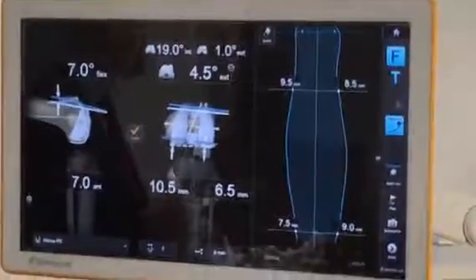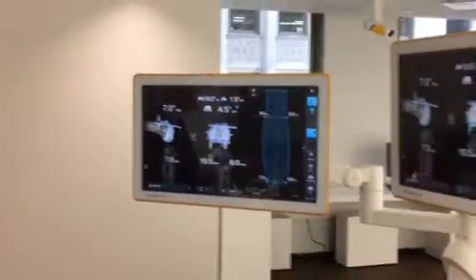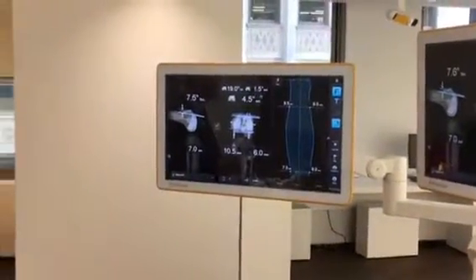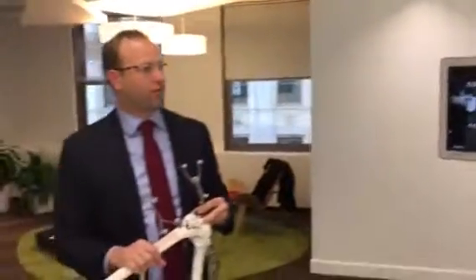Here, if I find this is correct, with an anterior shift, that's a pretty considerable one, I can pin the block there. I can also downsize the component and achieve the same effect, and that'll affect the graph in real time.